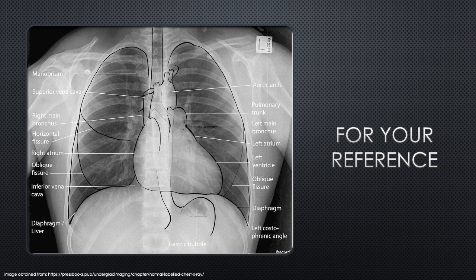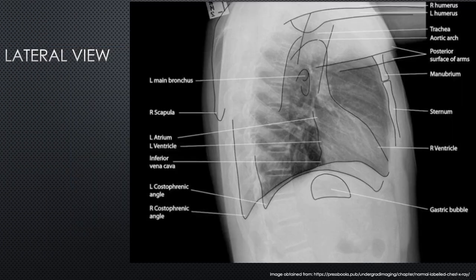Here is an image with outlines of the anatomy just for your reference, and again as a lateral view.